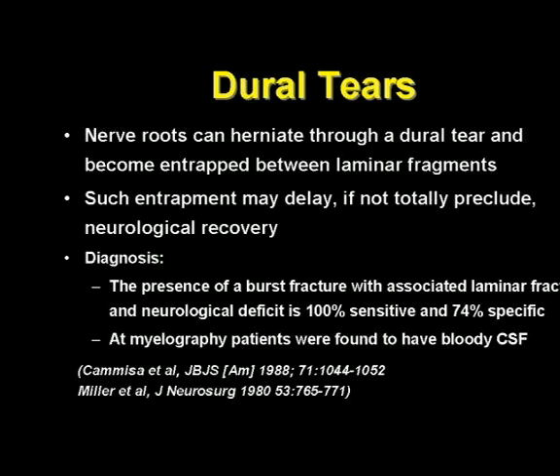Finally, a dural tear, and I got interested in this because the surgeons would come out from surgery and tell me, why didn't you tell me there was a dural tear? Well, I told him I can't diagnose a dural tear. And I looked into the literature and followed it for a while, and we started looking for this.